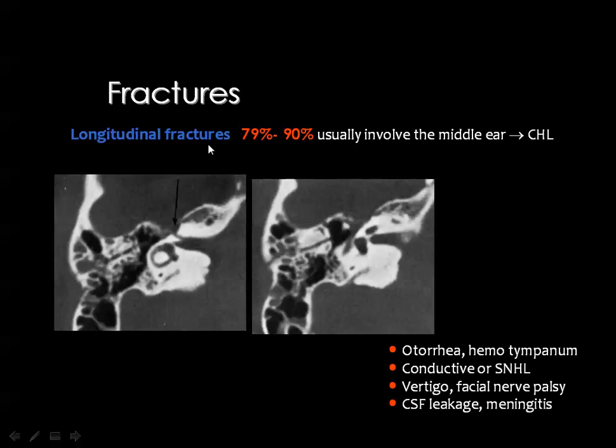Longitudinal fractures are very common compared to the transverse fractures, and these fractures usually affect the middle ear structures, leading to conductive hearing loss.